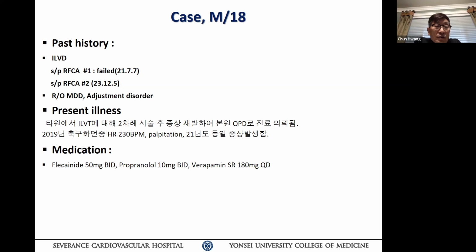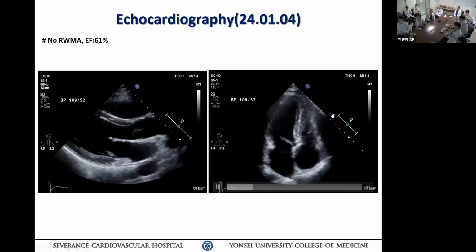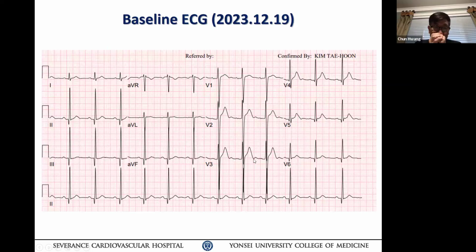아직 어블레이션한 디테일은 리포트 못 받으셨고. 근데 그 clinical tachycardia is the same as a previous ablation or this is different? Do we know? 뒤에 EKG 실어놨습니다. 엑스레이선 특이사항 없는 환자분이고, 에코에서도 사이즈 괜찮고 EF 괜찮았습니다. 그래서 본원 내원했을 때 레스팅 상태 EKG고요.